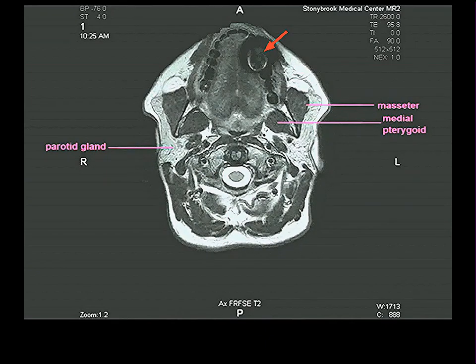This thing, for years I didn't know what to say that was, and then one of the students in the class who had been a radiologic technician said, that's what happens in an MR if a person has a filling in their tooth. It makes this big ugly thing that looks like a tumor. So it is an artifact of a filling in the tooth. We're going to see exactly the same things that we saw in CT, so I don't really have to spend a lot of time. We're going to see some things much better.